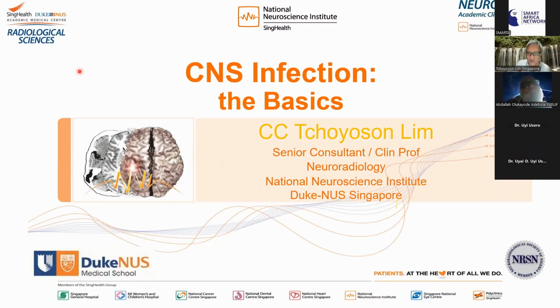CT is extremely useful for cerebrovascular diseases because CT angiograms and CT perfusion are very sensitive and excellent for quick assessment of many diseases. But for CT, the range of findings is very limited, and we spend a lot of our differential diagnosis on MR. So my presentation is going to be quite MR heavy, and it will be based on an article that you can download freely.